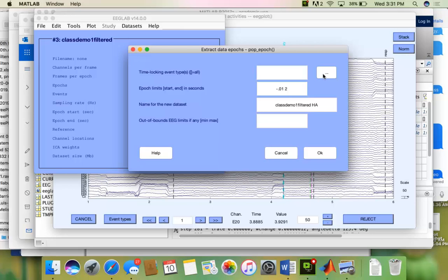For the human brain, visually 1/100th of a second is a very, very short time, and our eyes cannot discern the difference. Why do I not start it right on the stimulus? No reason. We could actually start it after the stimulus if we took away the negative sign. So for all intents and purposes, we get 2 seconds worth of data from the moment the person sees the picture until they respond. I could cut that down, but let's just leave it at 2.